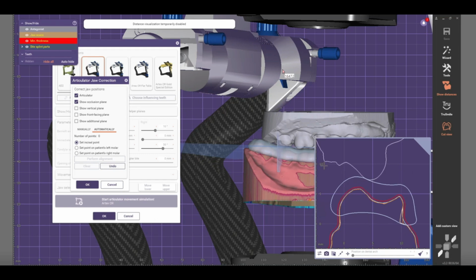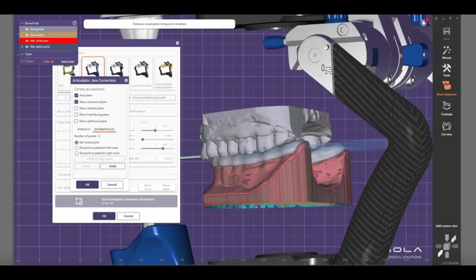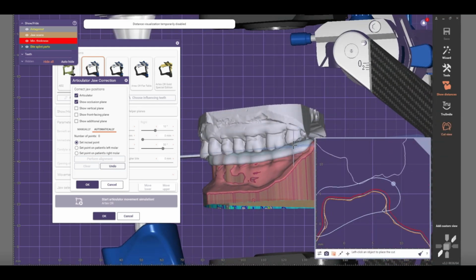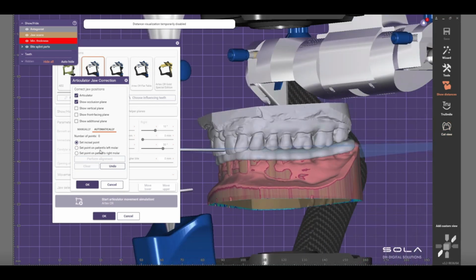Whatever you selected, 2 millimeters, it's roughly 2 millimeters of the bite night guard. That's going to make sure you can check either both sides, or you can check whatever is a reference, you can check that side. So it's roughly within that range of 2 millimeters that you selected. That's 2 millimeters, and you click OK.